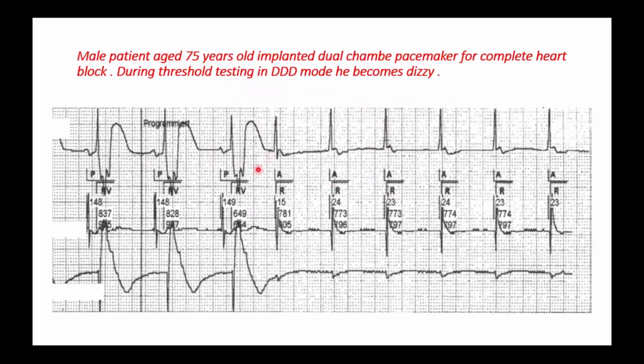So this is a patient with a dual chamber pacemaker, and here we start testing the atrium in DDD mode. What's happening then? As I said, this is almost historical now, rarely to be encountered.